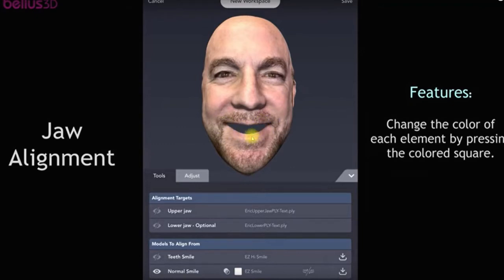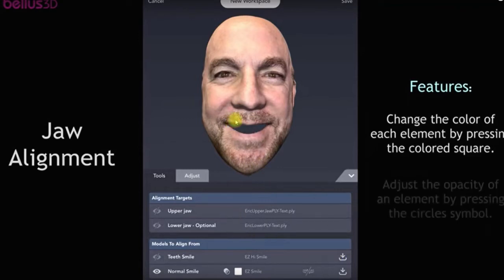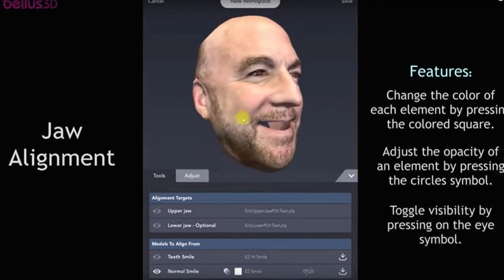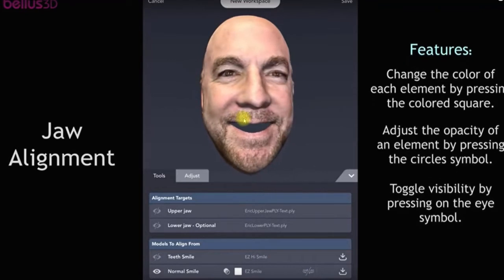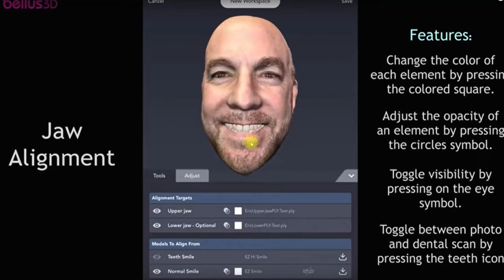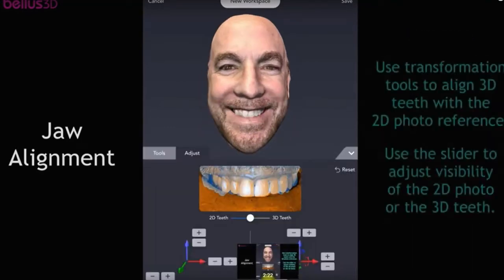I would say that you better save one with the teeth and without, so we can make sure that it got lined up when we're doing it the other way. So we actually have three. We bring in the retracted one and this one. So for practice right now, I'd bring in three. And if it didn't line up the teeth very well, you can adjust it.